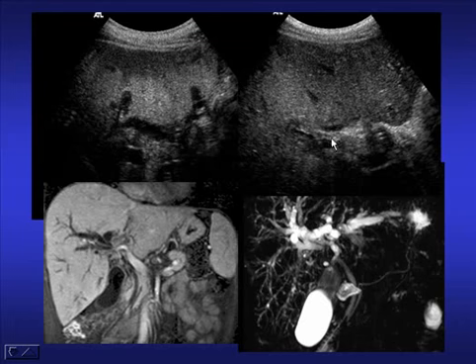and what we've found in our studies of this process is that the ultrasound contrast technique is as effective as the best technique we otherwise have, which is MRI, and significantly better than CT scanning, demonstrating the presence of a mass, demonstrating the size of a mass, and demonstrating the extent of invasion into the surrounding liver parenchyma. Very often the clearest images are obtained by ultrasound contrast rather than by CT or MRI, though each have their own particular advantages.